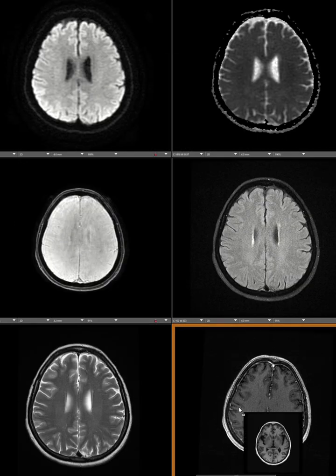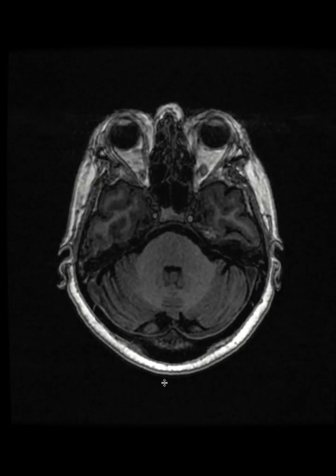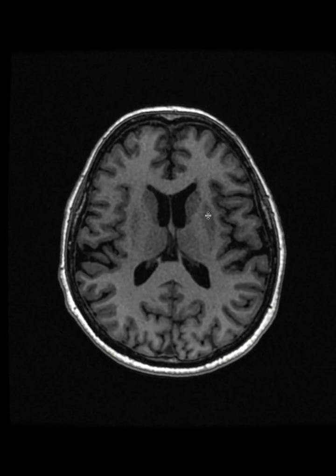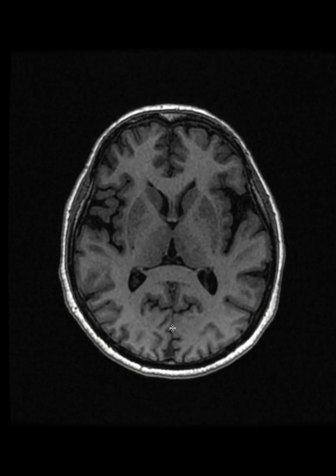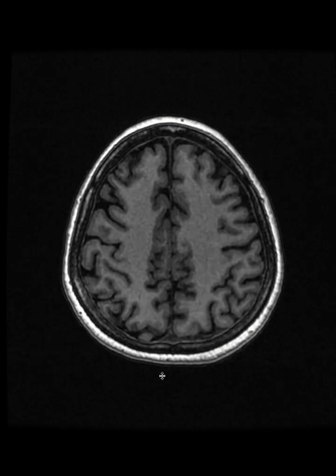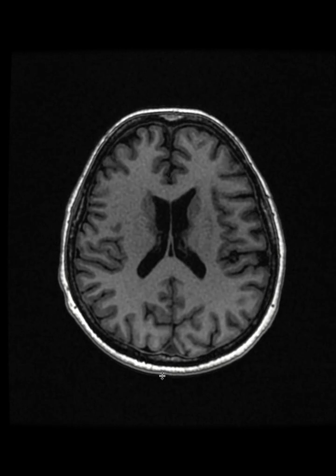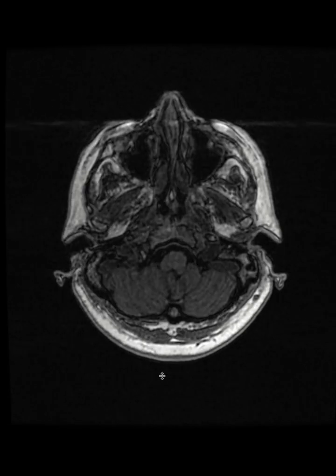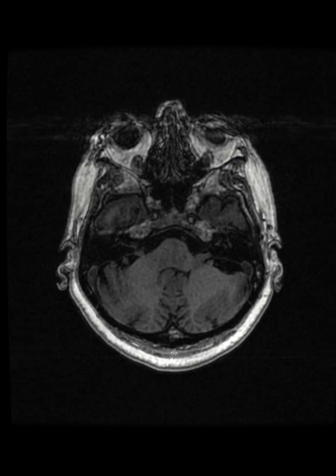If I want to show you just the T1 without contrast, it is going to be this sequence. So this is T1 without contrast, and you see that the gray matter is dark and white matter is white. That's how you know this is a T1 sequence. Without contrast, this is the appearance of the T1 sequence. Again, gray matter gray, white matter white, and then you don't see any vessels, you don't see dural venous sinuses. As you see, these are all dark.